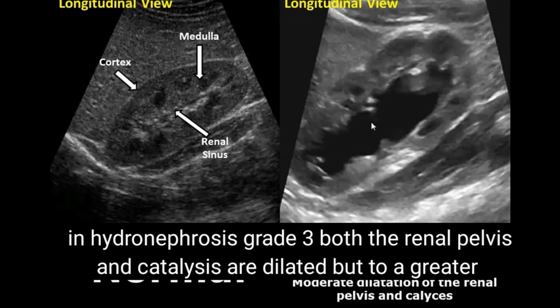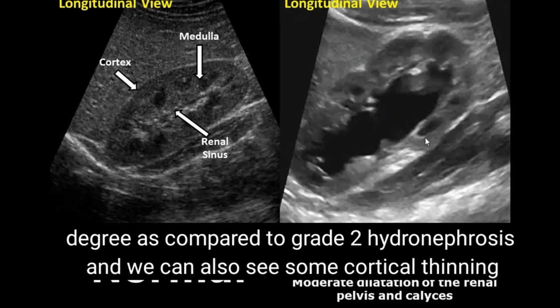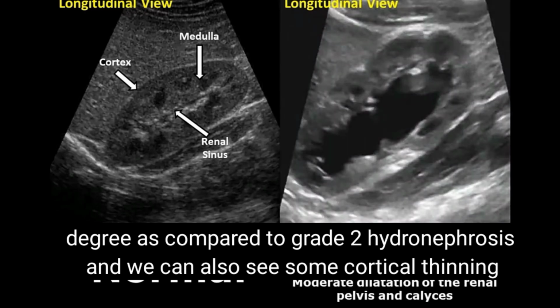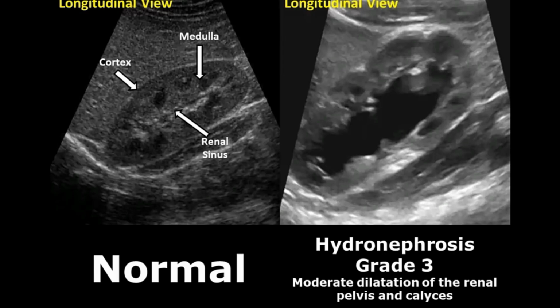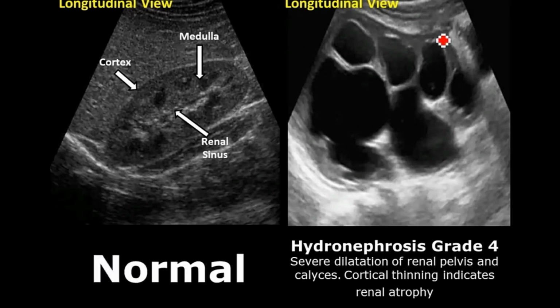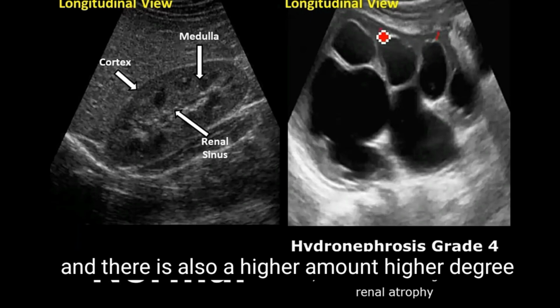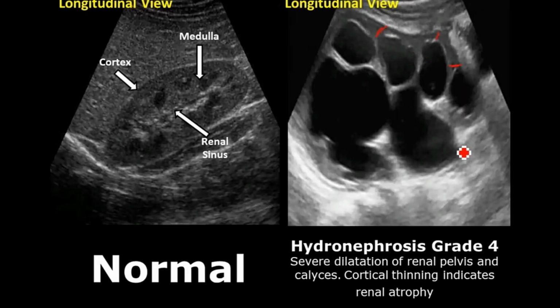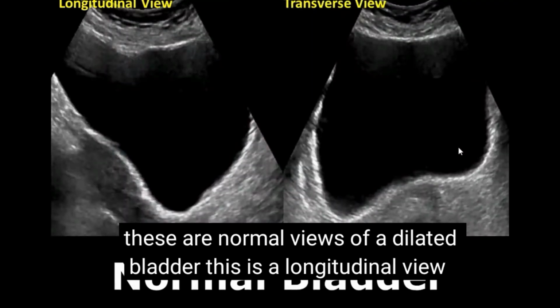In grade 3 hydronephrosis, both the renal pelvis and calyces are dilated to a greater degree as compared to grade 2 hydronephrosis, and we can also see some cortical thinning. Grade 4 hydronephrosis shows a very large degree of dilation involving the entire kidney, and there is also a high degree of cortical thinning, and it is leading to renal atrophy.